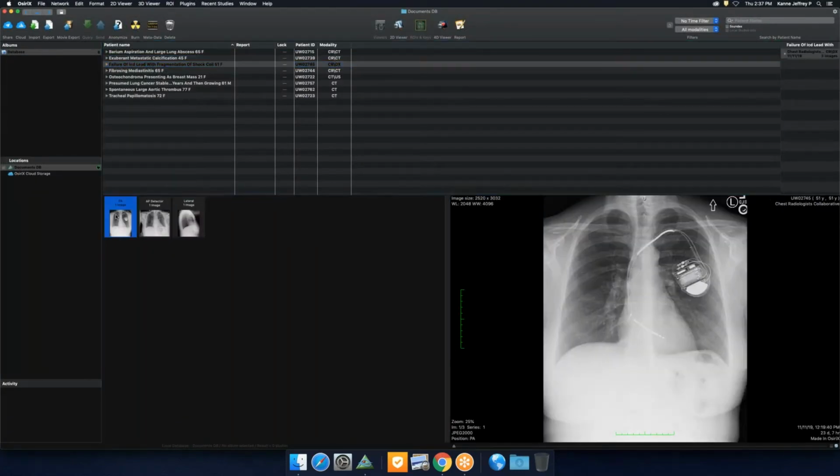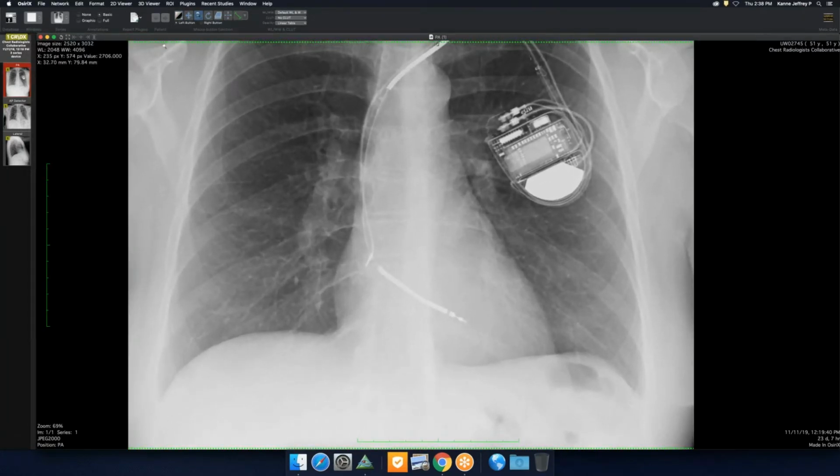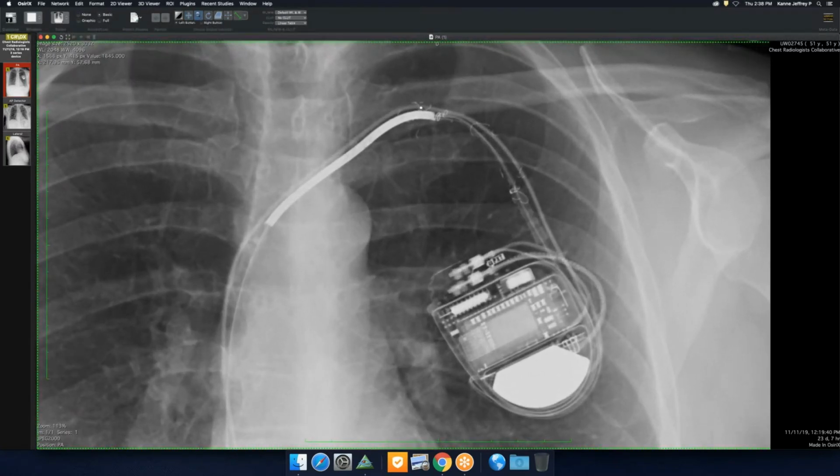All right, this is an interesting case. This is a little hardware case. So this patient has a defibrillator, one of the Medtronic ones here, and this is something I have not seen, but you can see there are all these little metal fragments around where the first rib and clavicle come together, and you can see the shock coil is unwinding. It looks like over the years it actually fragmented, and these are shock coil. And so they actually removed this thing because it wasn't working anymore, and some of them seem to have even migrated, so these are presumably in the chest wall.